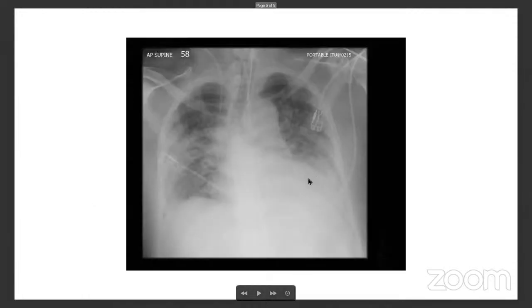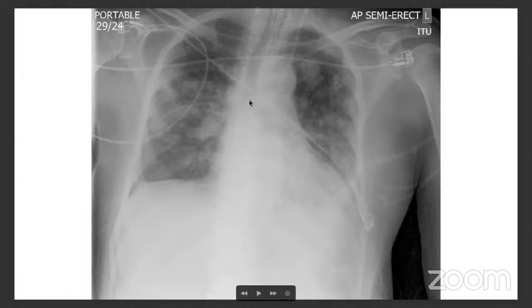And as you come down, as you can see, these kind of nodules, like the development of the organizing pneumonia pattern, is explained in COVID. So this is all mixed up with fibrosis and the active lesions. One of the questions in the chat box was whether you can differentiate a consolidation from a fibrosis. The answer is no. If you're just seeing a small opacity, whether that opacity is fibrosis, a consolidation or an active lesion, even CT sometimes struggles.